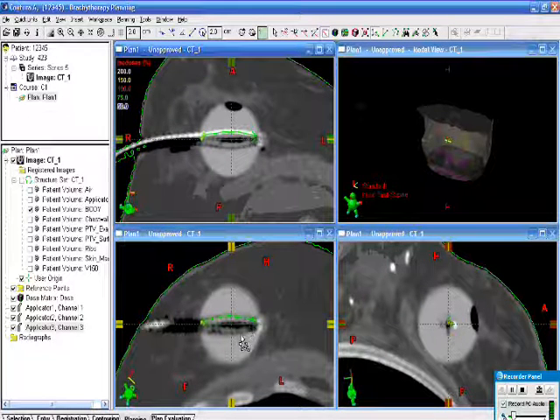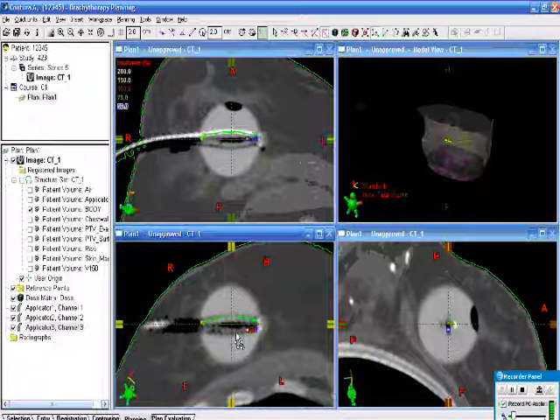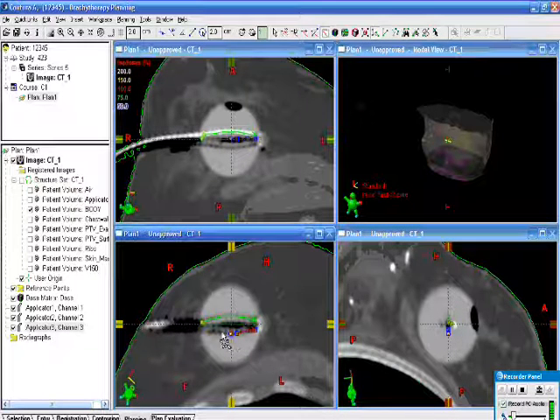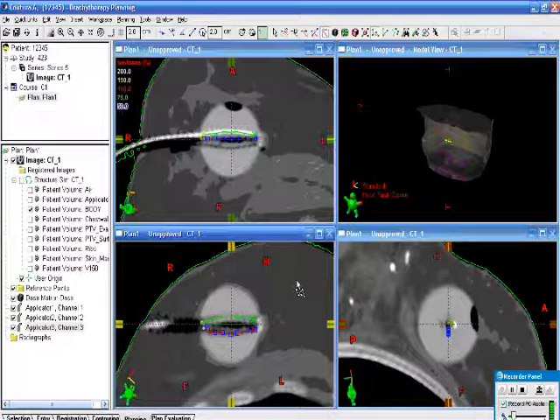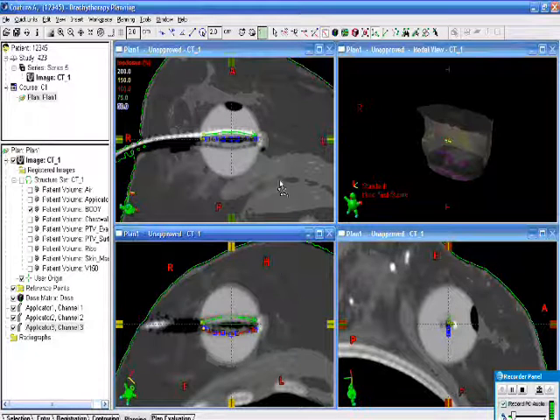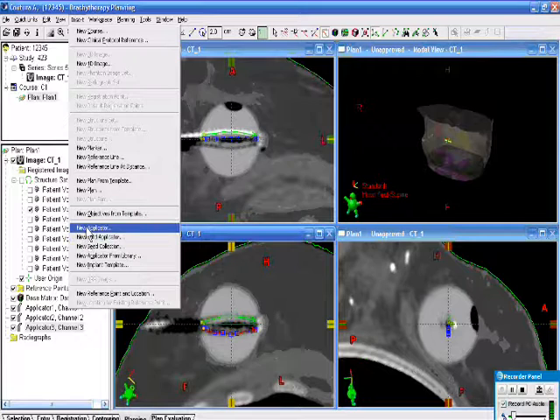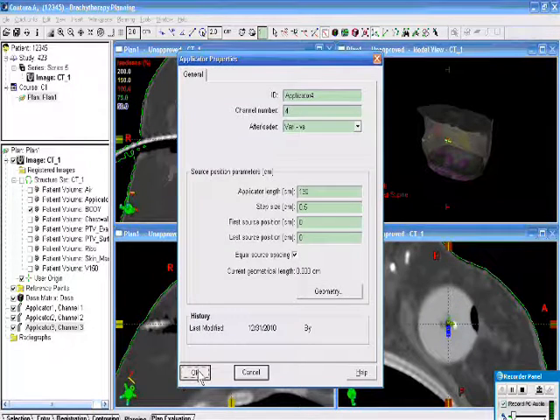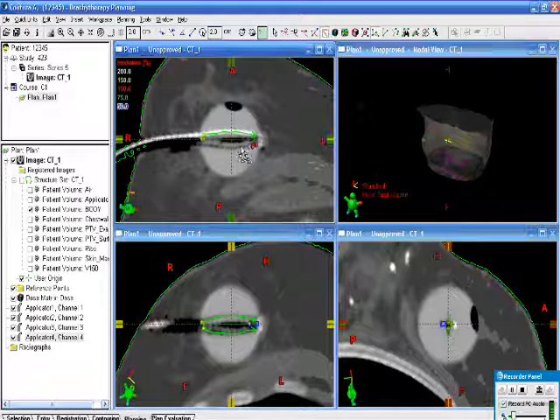And number 3 is going to be opposite number 1 here. We'll start where we can see it. In this view, there's not as good a visibility as in the view above. And that's just because of the way the original images are sliced differently to get this view than this view. And that's just part of the game. Number 4 is going to be right down here. This is a little bit easier than this view.